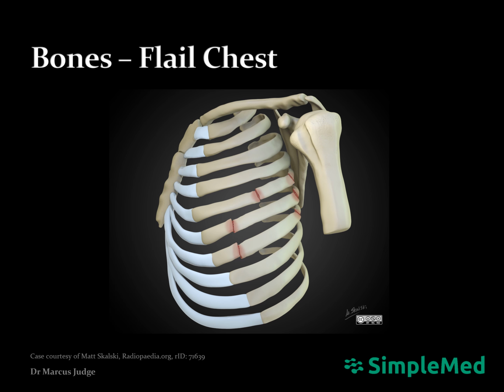When a rib is fractured twice in different places, the term floating rib is used to describe the fractured segment. When 3 or more contiguous floating ribs are present, this is called a flail chest, a life-threatening complication of rib fractures. A flail chest is usually associated with significant blunt chest wall trauma.